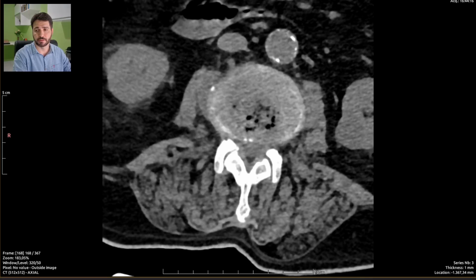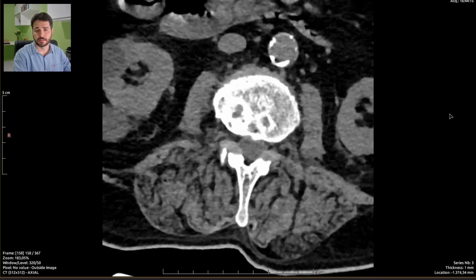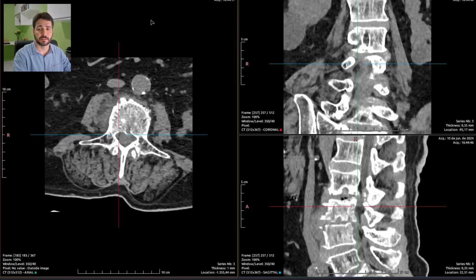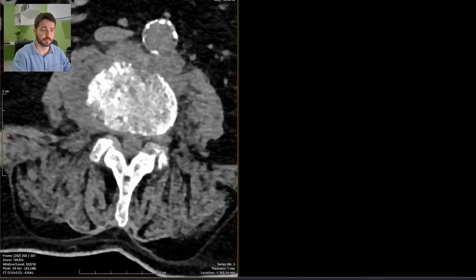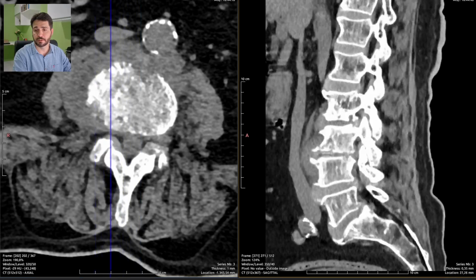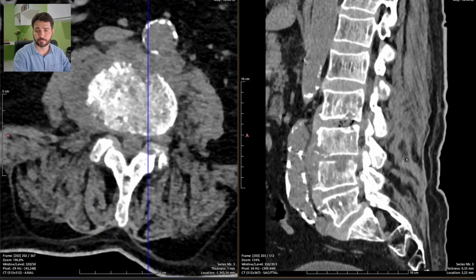All kinds of degenerative disease of the discs. This should have been an MRI, but it's firstly a CT scan. So let's see what we can do. If it's a scan, it has to be reported, and scans don't report themselves.